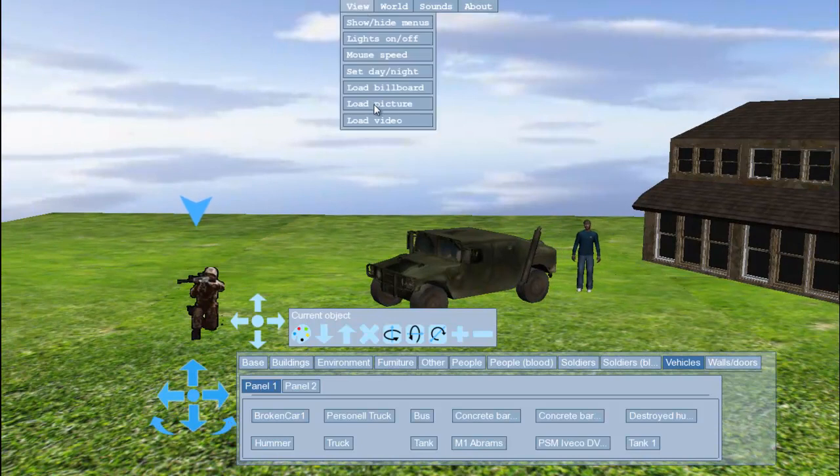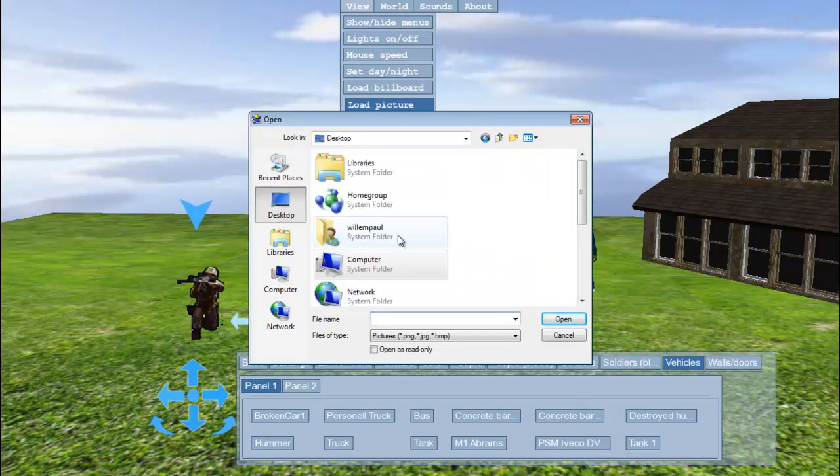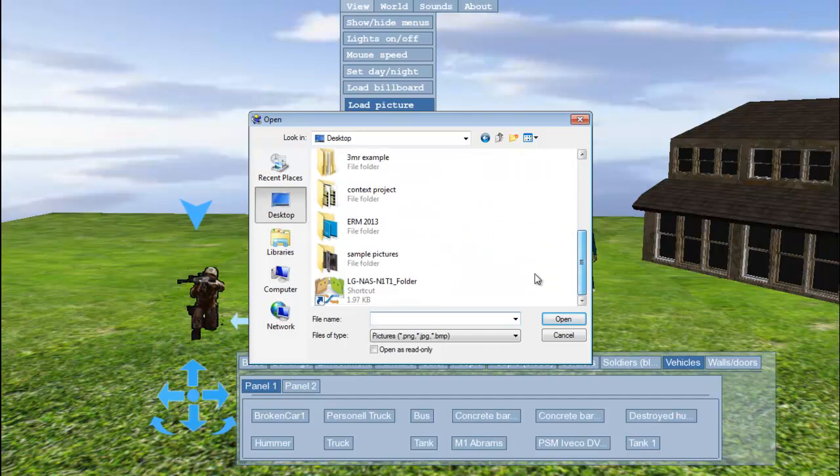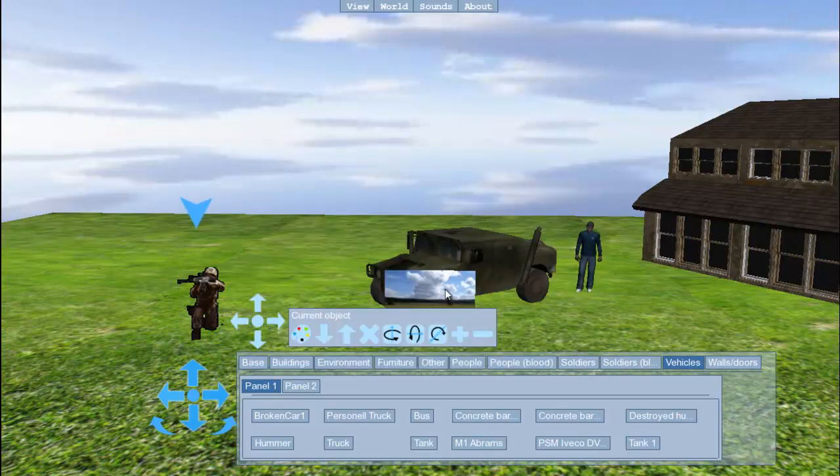Now, let's do the opposite. Now, a picture. I will take a background picture I like to have. Create a couple of them. So let's, I think this is a nice background picture. So I first click it.